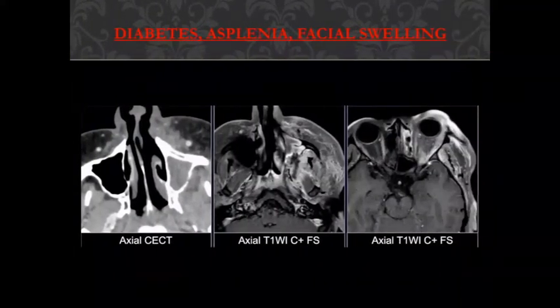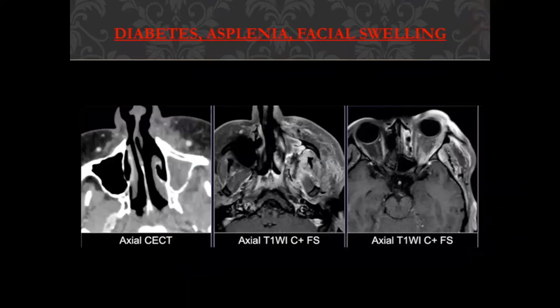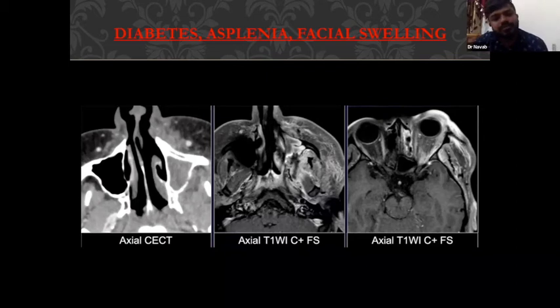A diabetic patient with facial swelling. What are you seeing? Sir, Iria is online now. If you want, he can continue. Iria, can you hear me? Yes, sir. What are you seeing on the CT? I'm seeing soft tissue opacification of the left maxillary sinus, also in the premaxillary area.